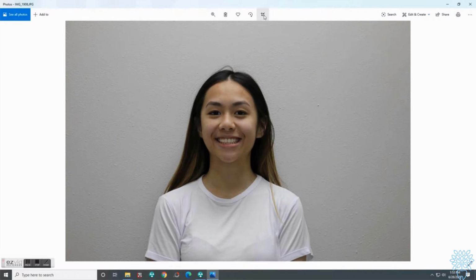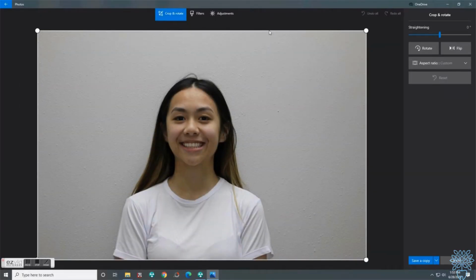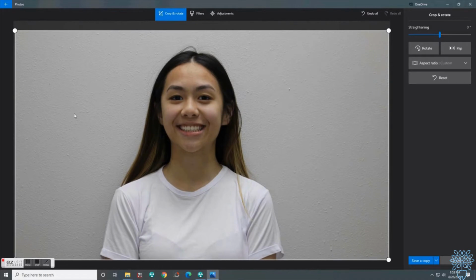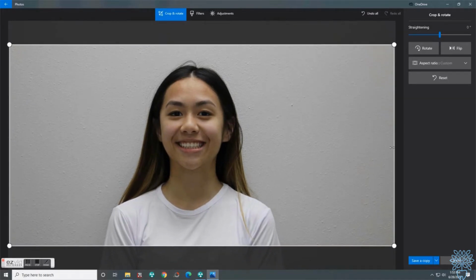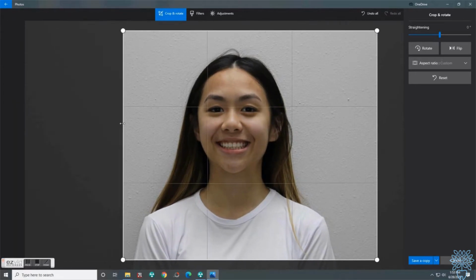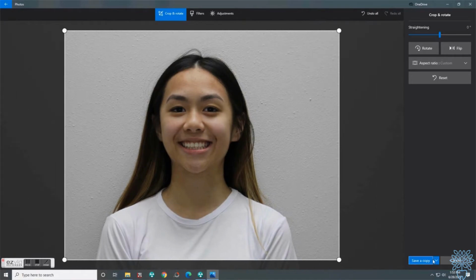So this is actually an example here of one that was okay, but she's slightly tilted away from the camera. So remember, when you're taking pictures, you want them to look directly at your face. You want them to look directly at you while you're taking the picture. And this is okay, this is good, but she's ever so slightly looking away. But yep, we're trimming it up, same thing as we did to the last one.